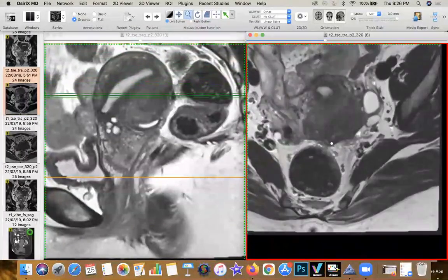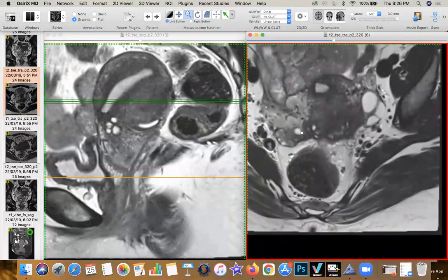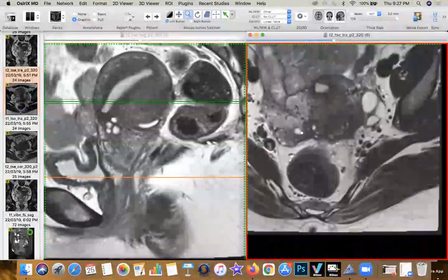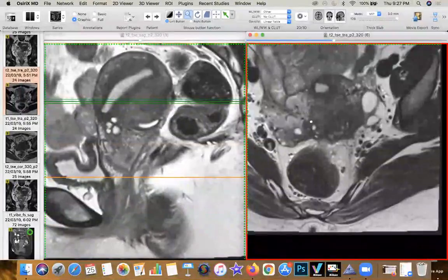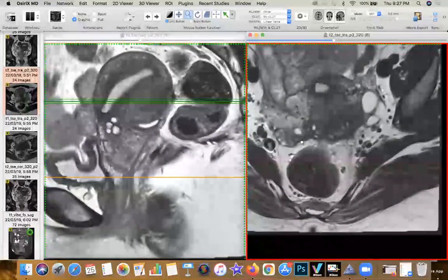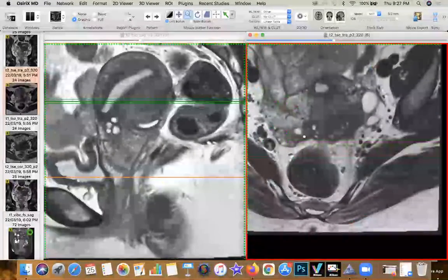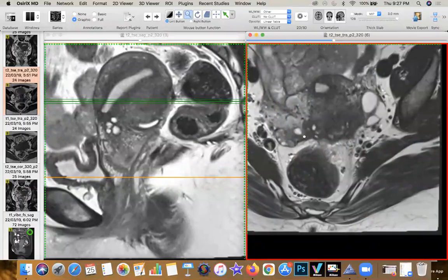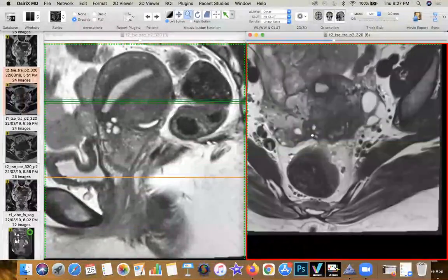If the endometriotic disease is a little more proliferative and extensive in the pelvis, it tends to not only affect the rectum, but it also tends to tug onto the broad ligament complex and the ovaries. And the ovaries are also now no longer floating in the pelvis or ectopically located in the lower abdomen, but they're actually pulled down into the parauterine spaces. And these parauterine spaces are seen very conveniently on the axial T2 weighted images. And you can see that both ovaries are now no longer free floating in the pelvis. You don't have that intervening fat plane, but what you have is that the broad ligament around the ovaries is wrapped around and plastered to the posterolateral surface of the uterus.